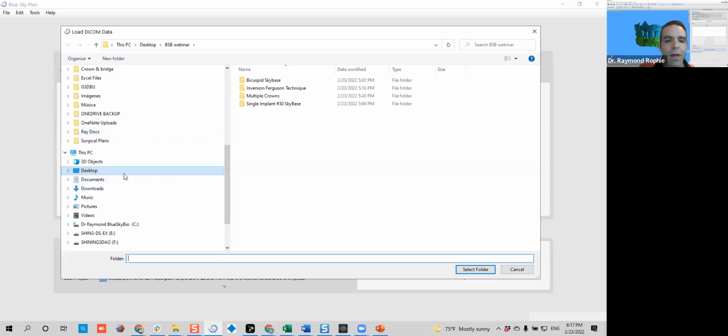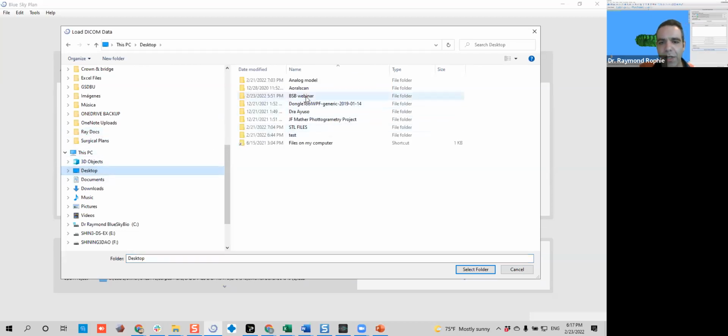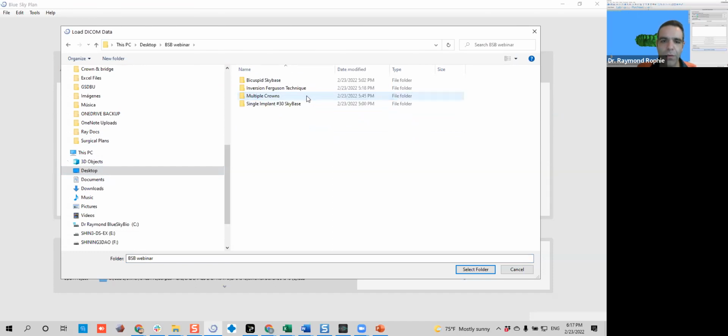So here I'm going to go to my desktop and check the folder that I have for the webinars. In this case, we have the one case that Dr. Miller was mentioning about the digital pouring, or the Ferguson technique, about how to digitally pour impressions.